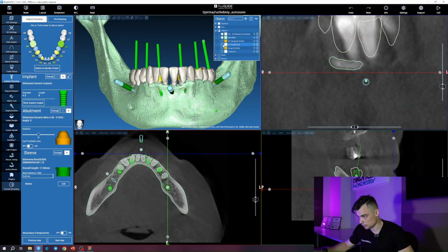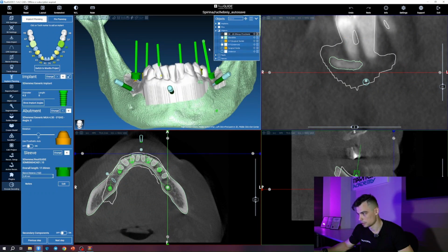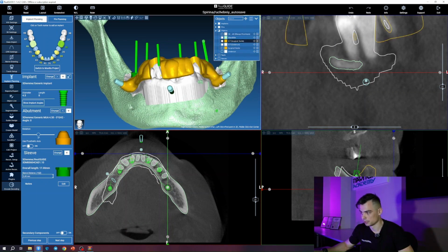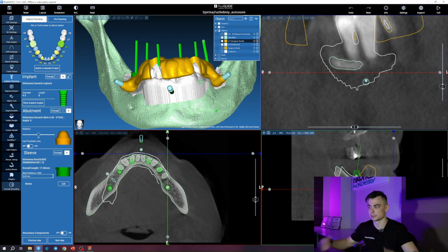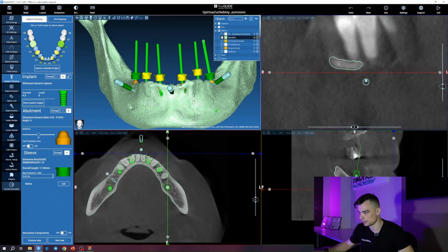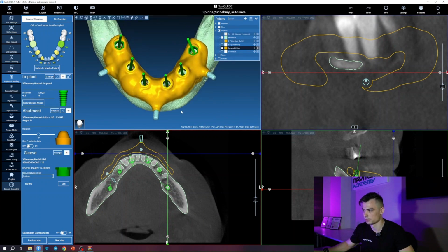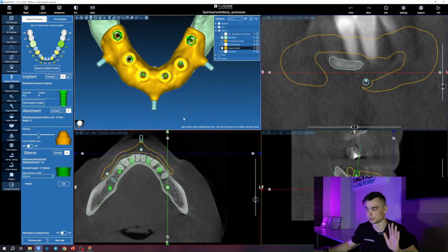Let me take a moment to remove this so we can see more clearly now. As you can observe, we have these teeth right here in front of us, which are the ones I want to focus on for now. Do you see how they are positioned? We'll use them to position this dental template with 2 fixation pins. Next, the teeth will be extracted, exposing the bone, like this. And then the surgical guides for preparing the bone beds for the implants will be placed.